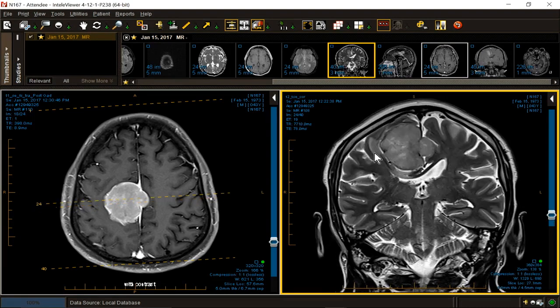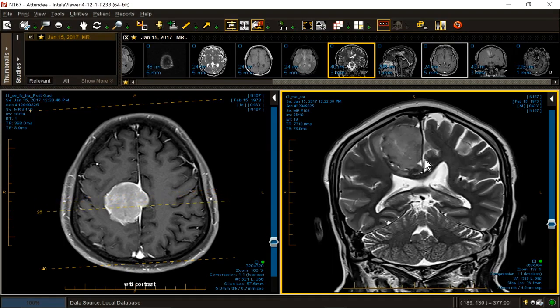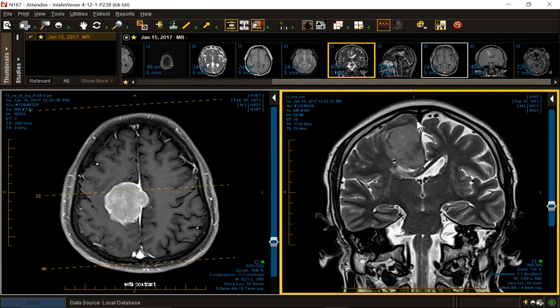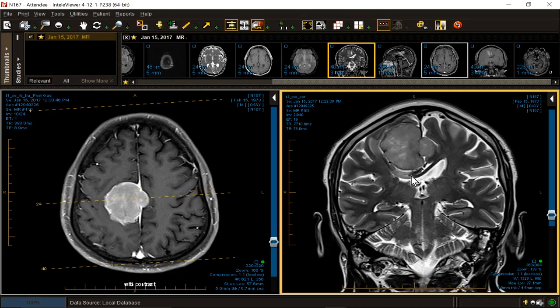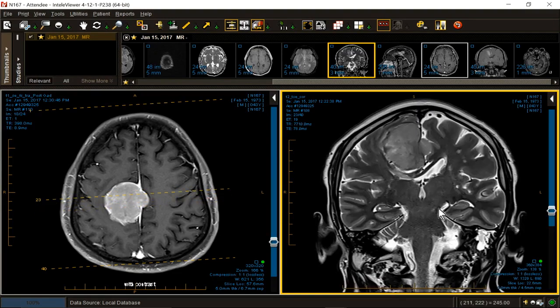Edema around meningioma is particularly common. The fact that it goes to the other side is a little bit unnerving. These tumors are seen more frequently in women and can be estrogen sensitive. They can also occlude the superior sagittal sinus. This one doesn't. There is downward herniation or downward displacement of the right cerebral hemisphere. Temporal horns are not big, so there is not generalized hydrocephalus.